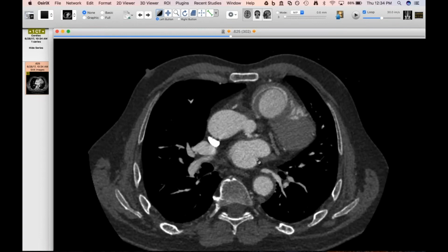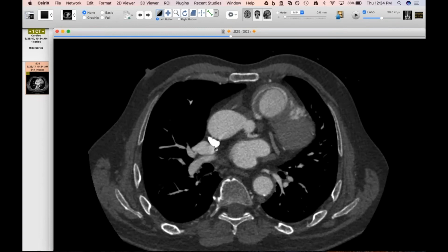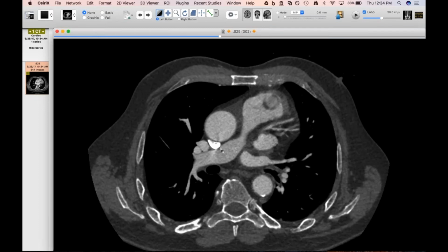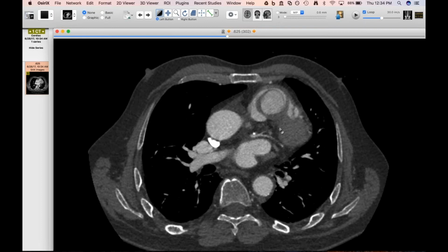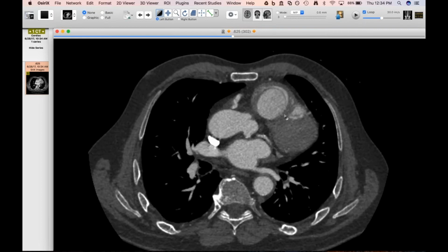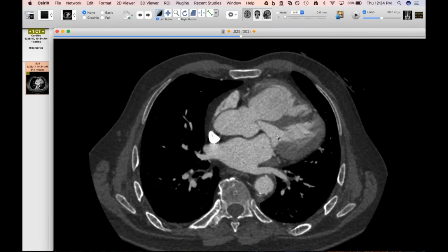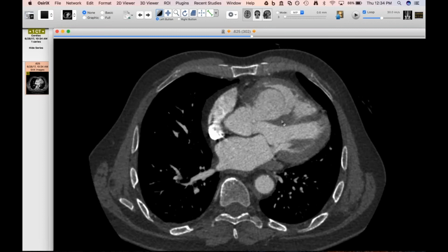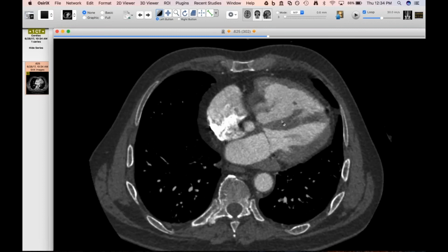And this guy originally underwent a CT, I think, to evaluate for thoracic aortic aneurysm because of some sort of tortuosity on a radiograph. And this is a total incidentaloma in this case, but you see there's this weird thing in the RV outflow tract. And it turns out to be an enormous sinus of Valsalva aneurysm arising from the right coronary cusp.